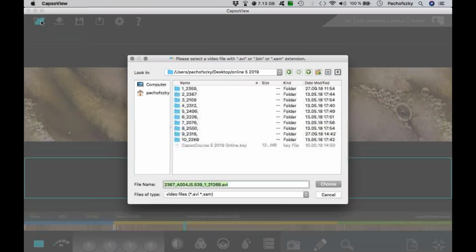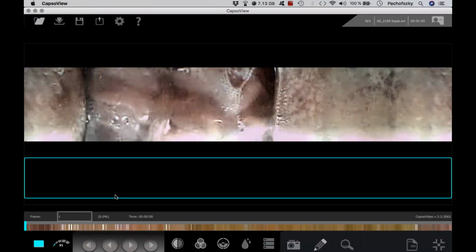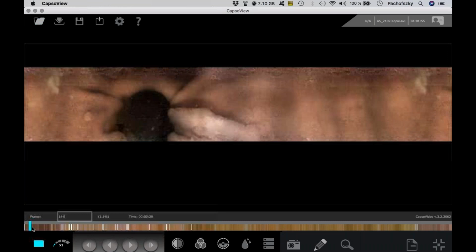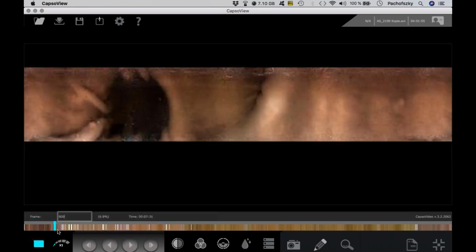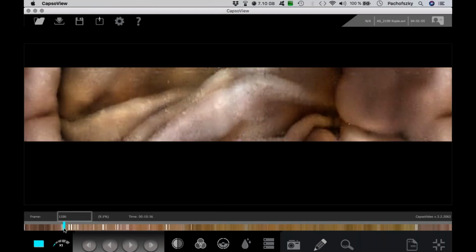So I will show you another case. I will go on with this. So even the same procedure, click inside of the bar and go down quite slowly. You can see we have here the small bowel. There was a change. If you look at this, you can see a lot of funny stuff here inside.